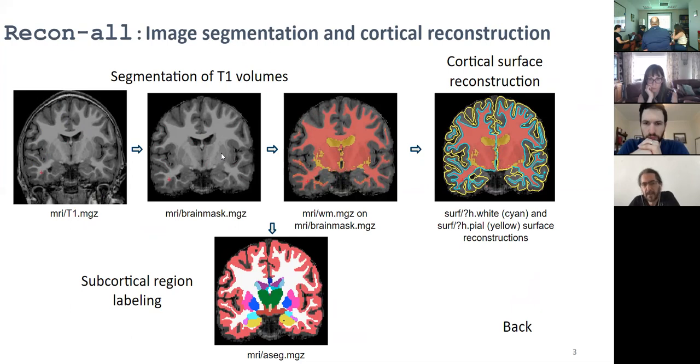I see what you mean, but FreeSurfer still doesn't have that capability for parcellation, right? It just does it for the whole structures, like the whole thalamus and the whole caudate. The default is to just segment out these subcortical structures. Correct. But it would be possible.